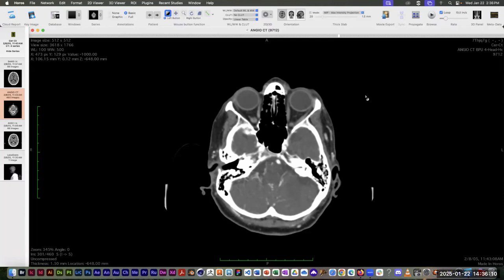So Horos could easily detect that boundary between the bright white bones and everything else. Or alternatively, Horos could detect the boundary between the skin and soft tissue and the black outside of that, which is just air. And we can tell Horos which of those boundaries to identify: the boundary of skin, the boundary of bone, etc.